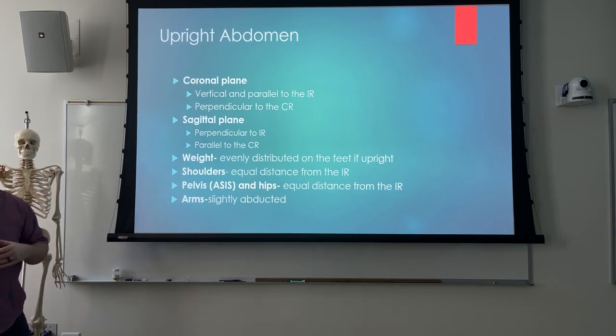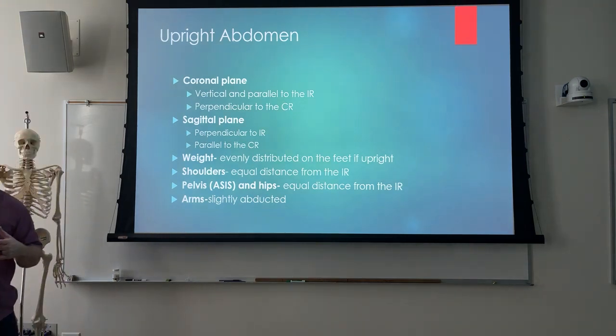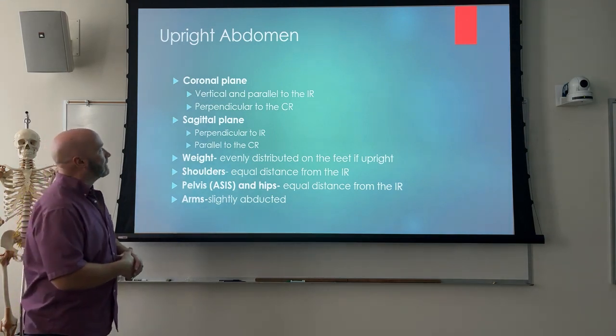On chest x-ray, back in the days of screens and films, you could see it easier than you could on an upright abdomen. So some of your doctors say, nah, I want to see the bladder on the upright abdomen. Give them what they want. That's their protocol, their routine. You kind of see a routine here, right? Give the doctor what they want.